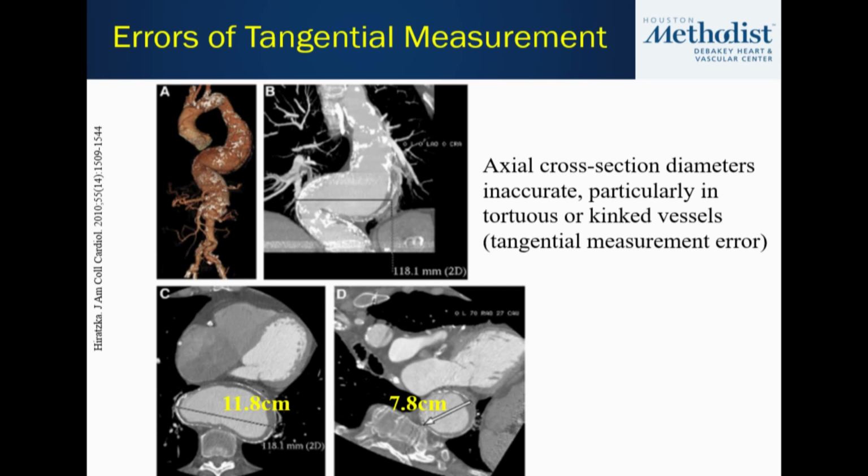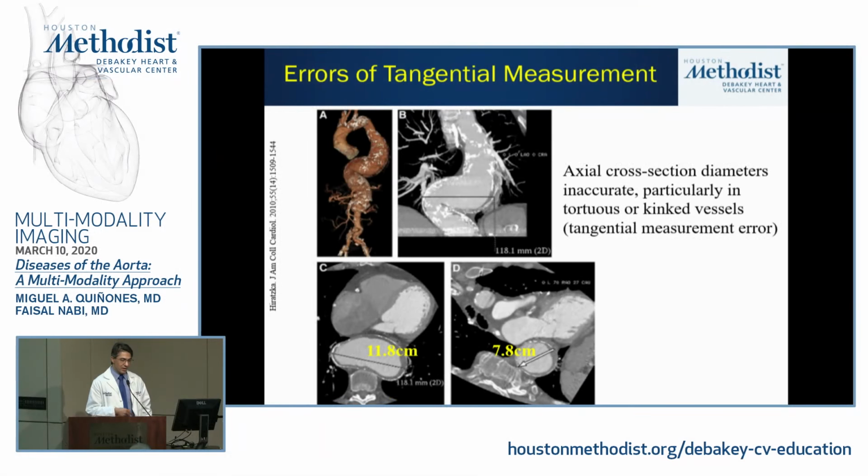This is also a good example of why the thoracic guidelines mention making external diameter measurements, because you can see the amount of mural thrombus in this bottom image, and you would be taking into account that thickness of the wall.